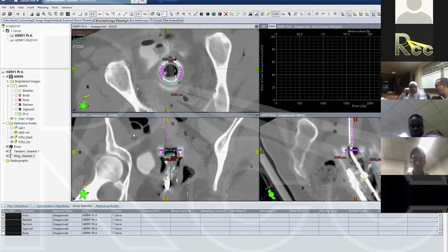Since we're at about an hour, why don't we check in again and see. From this point here, we would just add our doses like Derek did, our 15, 10, 10 dwell weightings, and then normalize it to our point A, which he defined earlier, and then look at our dose statistics, and then go back and forth between our dose statistics and our EQD2 spreadsheet.